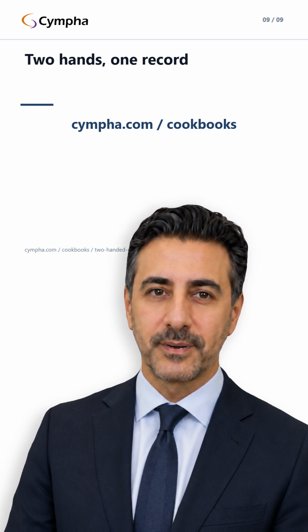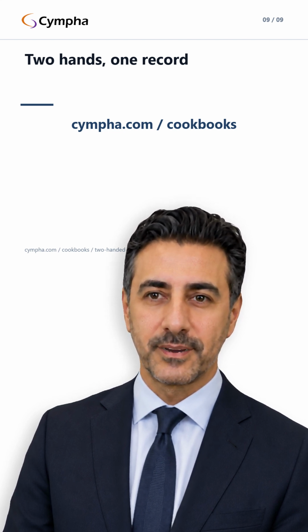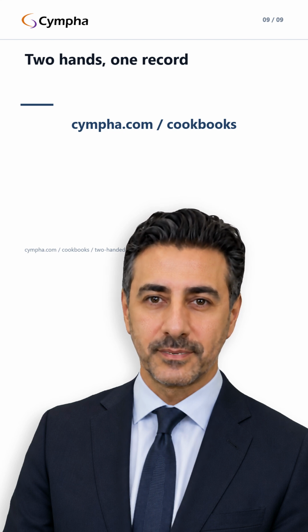That's two-handed case creation on cympha. One record, written once, from the chair all the way to the lab.